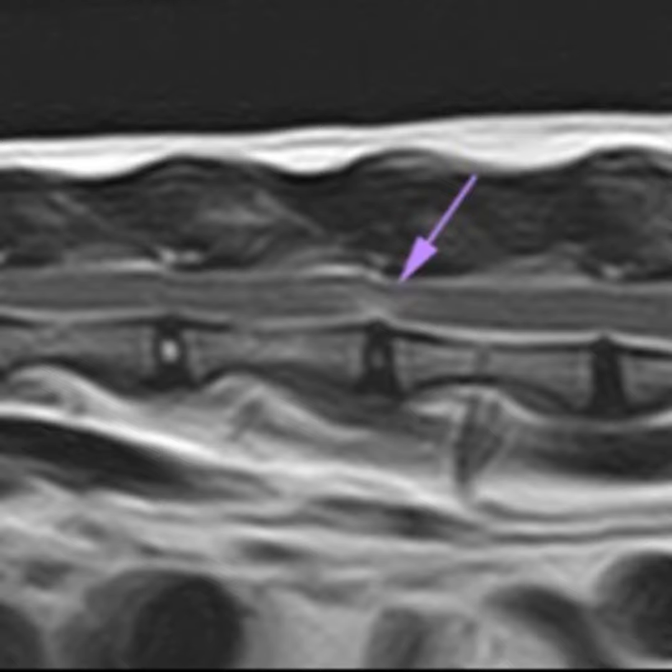No, the MRI studies included at least T2 and T1 weighted images. So we think that these 2 sequences are sufficient for the diagnosis of intervertebral disc herniation. So we didn't use additional sequences for the diagnosis.